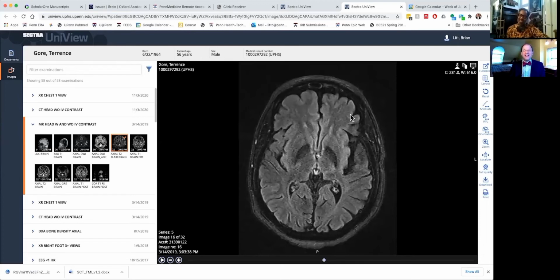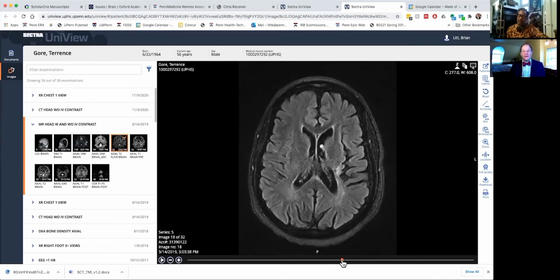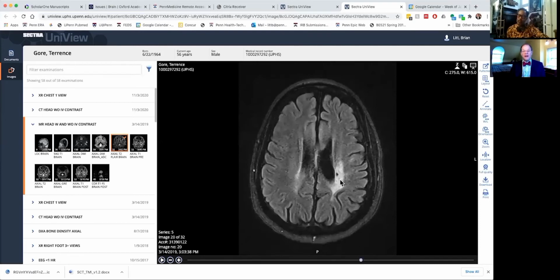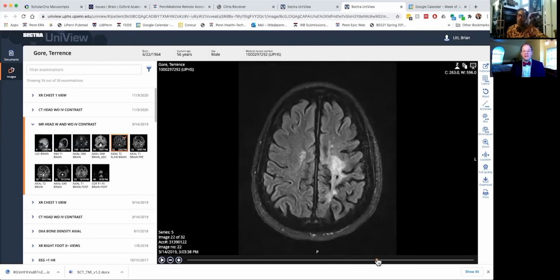These are areas, the frontal lobe, judgment, rationality, those are completely normal. But as we get higher up, you start to see this white matter abnormality here. And it's primarily on this left side. And it starts in an area that's closer to where the leg is involved. And that's probably where your difficulties began. And then it moves up into these areas where the hand and arm are controlled.